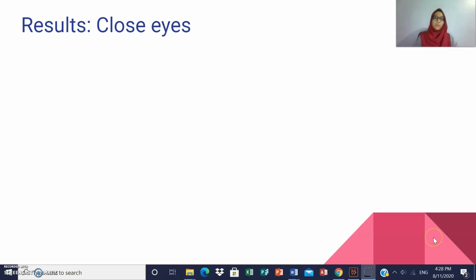We can certainly see a shape here, but if you look closely, there's only the blue and purple line here. The blue and purple lines indicate the C3 reference and the O2 reference, but for C4 and O1, they only exist here in the beginning.